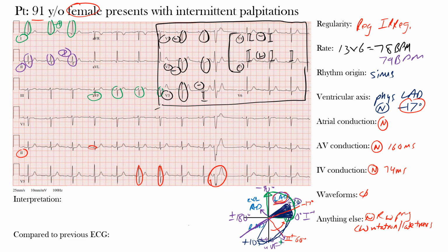You can think of the normal conduction pathway as being the highway system and the fastest pathway to depolarize the ventricles, which typically gives you a narrow QRS complex, as we see in most of these complexes, okay? However, if you're originating from within the ventricles, as we see in these complexes here, now you are outside and you're taking those back roads to the ventricles to depolarize them and originating from within them, okay? So it's going to be much longer to depolarize all of the ventricles, and therefore you have these wide ventricular complexes that result, okay? So we're outside of our normal conduction system, originating from somewhere within our ventricles.